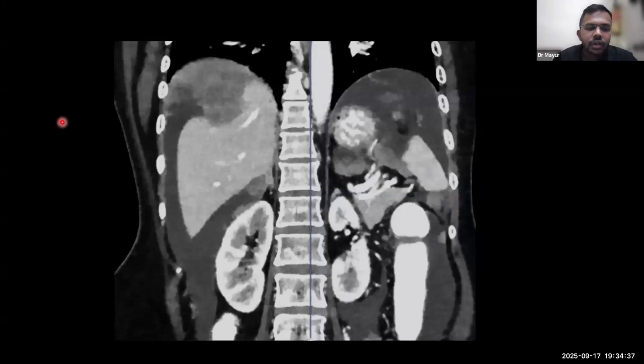Another example of peritoneal carcinomatosis where there are moderate sized deposits in the right subdiaphragmatic region. Few deposits are seen in Morrison's pouch. A deposit is beautifully delineating the gastrosplenic ligament, extending from the spleen to the stomach.